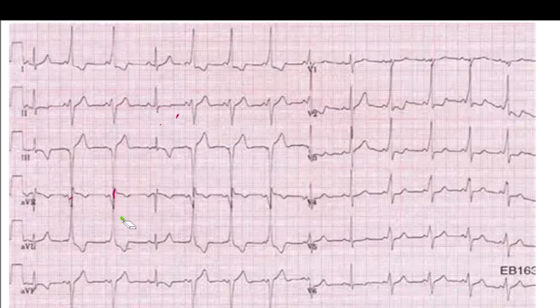So yes, you can logically explain why an inferior wall MI causes left axis deviation, why left bundle branch block causes left axis deviation, and why right bundle branch block causes right axis deviation. There are many examples, and as I mentioned, you can draw a diagram and you will get the logical explanation. All right, so that's it.